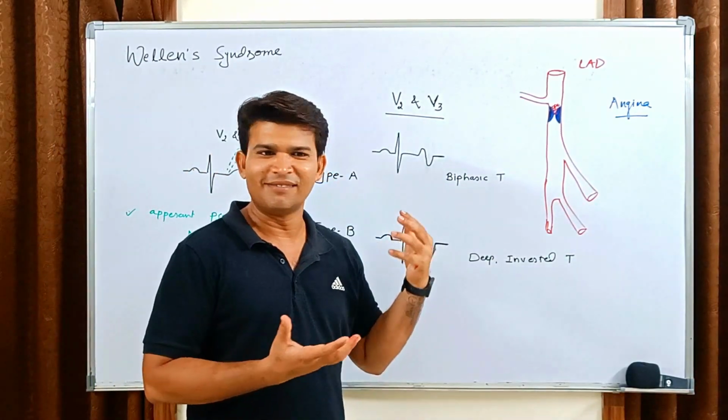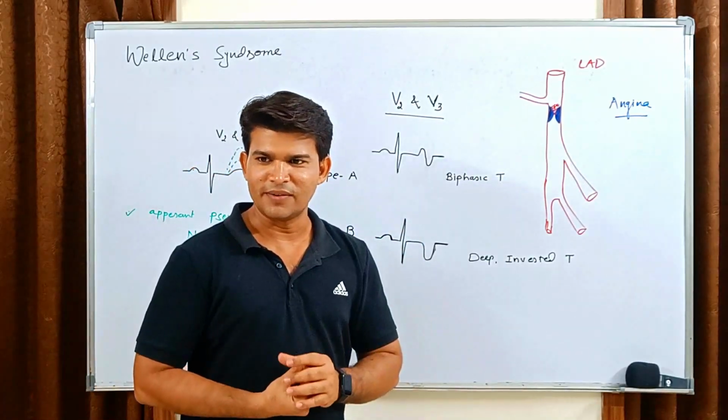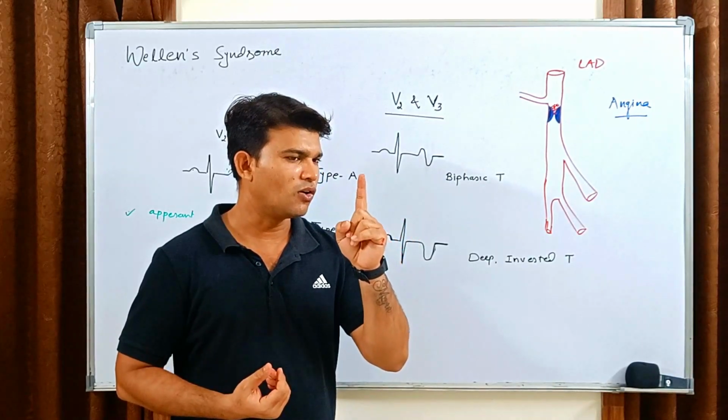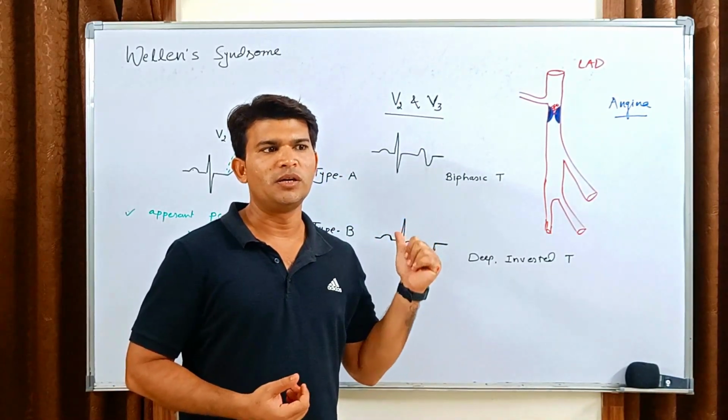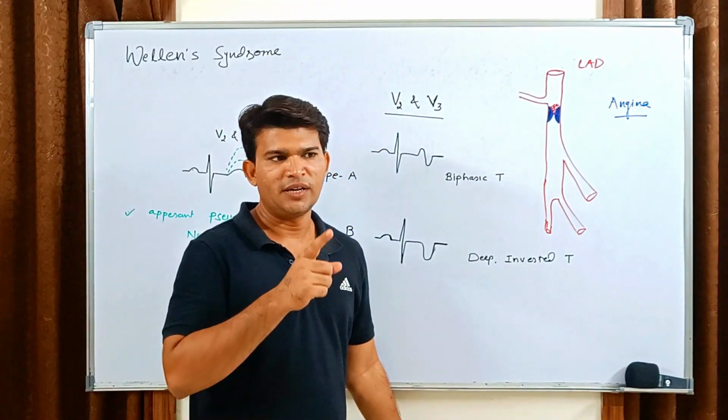I had learned about the Wellens pattern. I discussed with the sir: sir, the patient is having Wellens type A pattern. The LAD must be, or may be, critically occluded. The patient should undergo angiography, and it is a must.